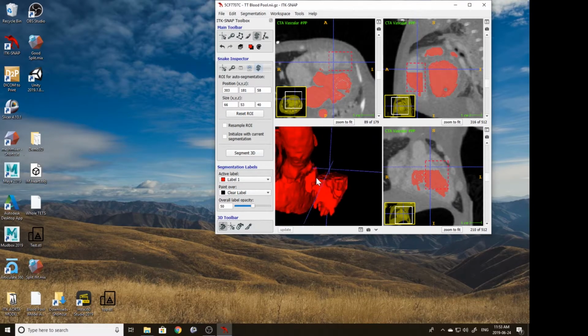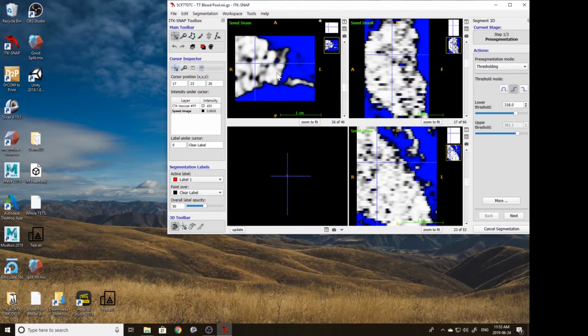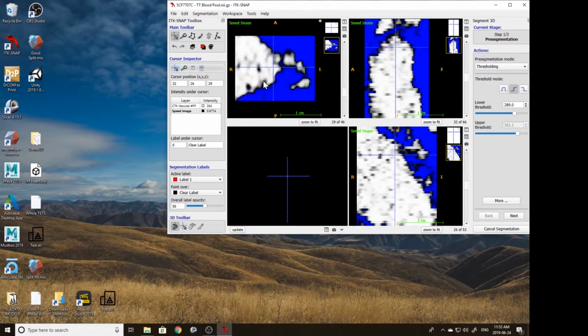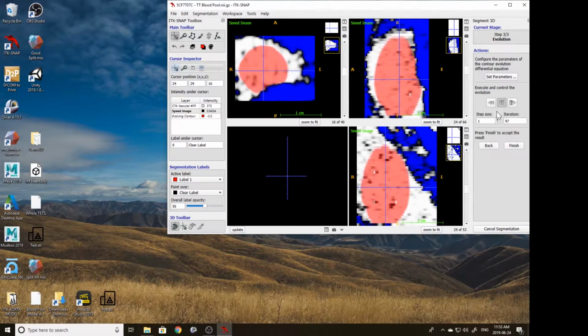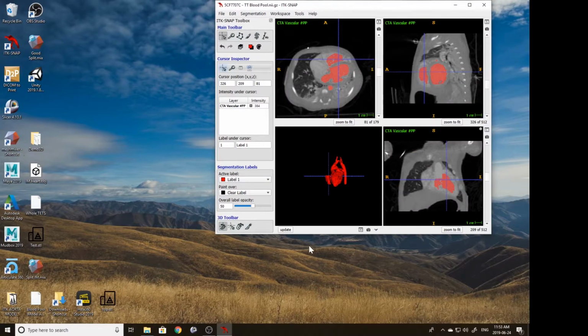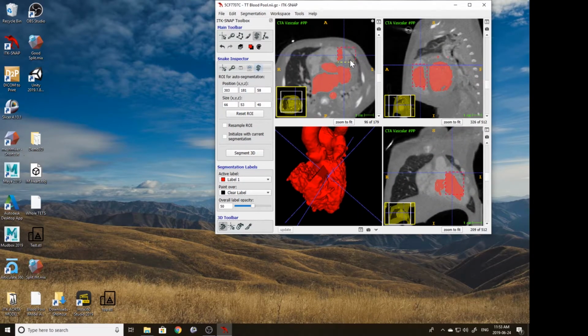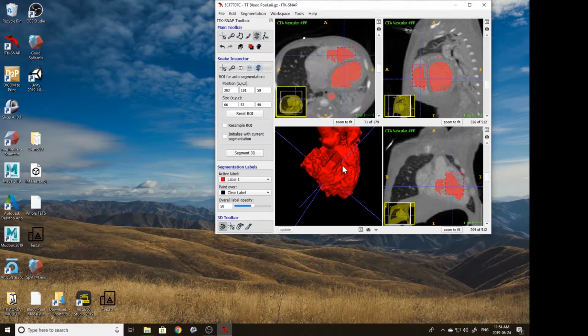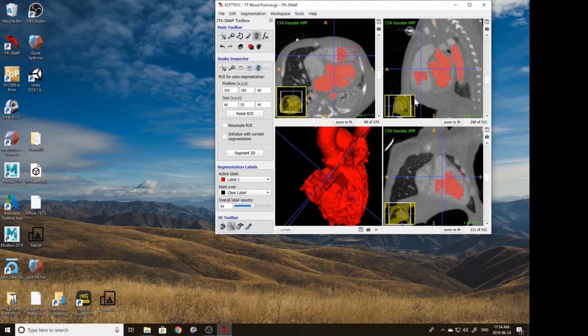Again, it can take a little bit of time, but it seems like the more careful I am, the less editing I'm having to do later on with either manual segmentations with the paintbrush tool or then in Meshmixer. So taking my time doing small segmentations is really going to save me time in the long run. So sometimes if you see stuff where it is crossing over into the wrong side, being careful to watch that segmentation and then pausing it before that actually happens, or just when there's just a little bit, gives you less stuff to segment out later on.